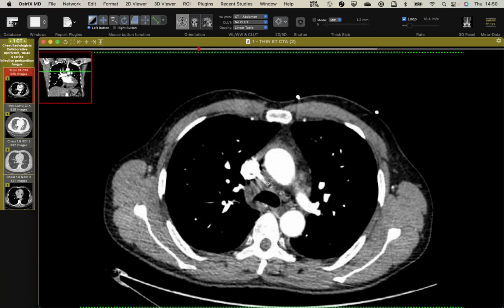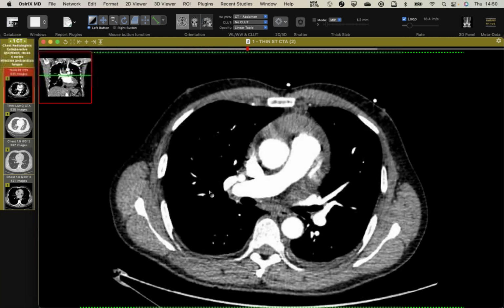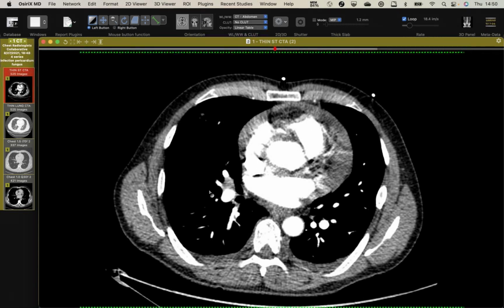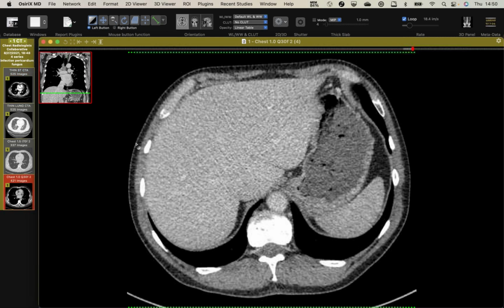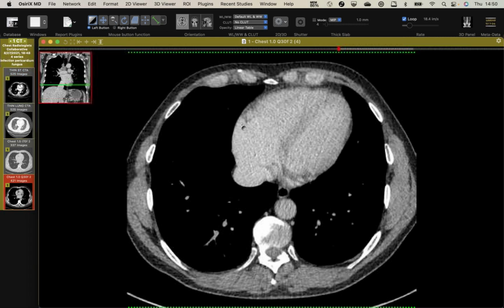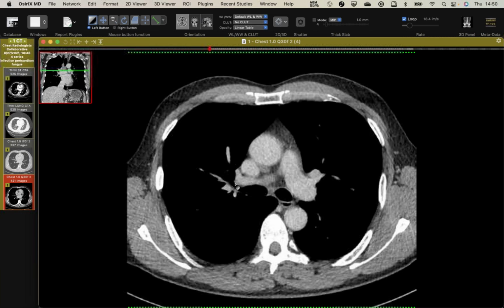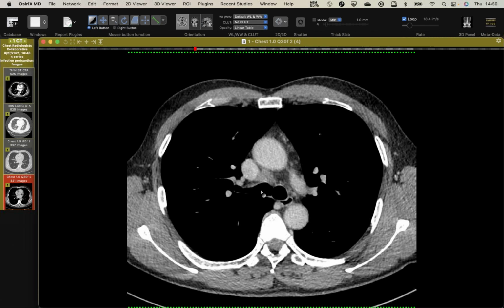With pericarditis, I suppose you could get some lymphadenopathy, but this asymmetry with these nodules for us is pretty classic for histoplasmosis. And so he was treated for histoplasmosis. His urinary antigen was positive. And then he was treated, and then presented later with some similar symptoms at an outside hospital. But you can see his pericardial effusion is resolved, and the lymph nodes are getting smaller, which they don't typically go away, but they're definitely smaller.